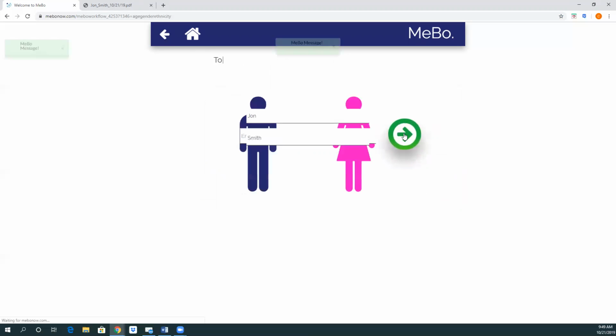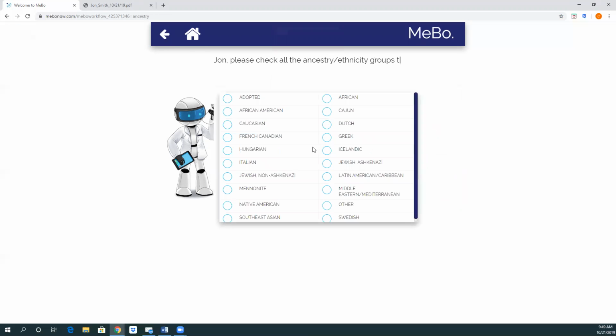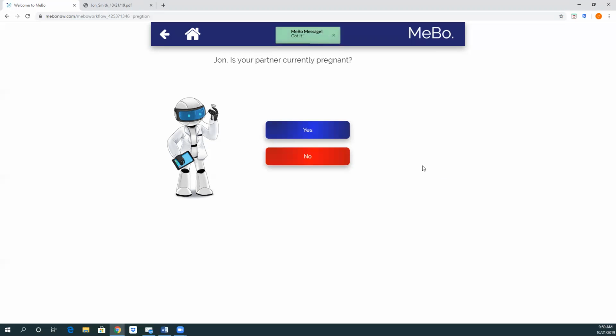But for now, we're going to go ahead and say that we're a male, and the ethnicity question comes up. Just a side note, we're going to assume that John's on Medicare, so that was a choice in the list, but let's just say that he pushed the wrong button, it's okay. So he's a Caucasian, so he's going to hit the green arrow. Now it's going to ask some questions that, again, we know John's on Medicare, but mebo does not know that yet, as far as how old he is.